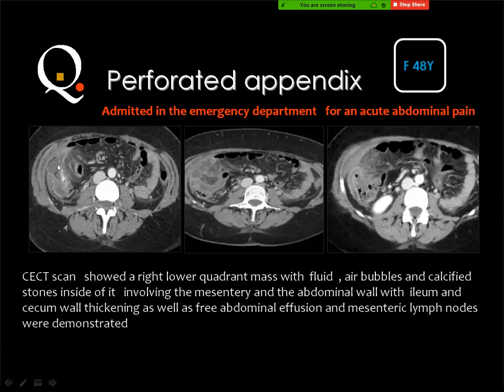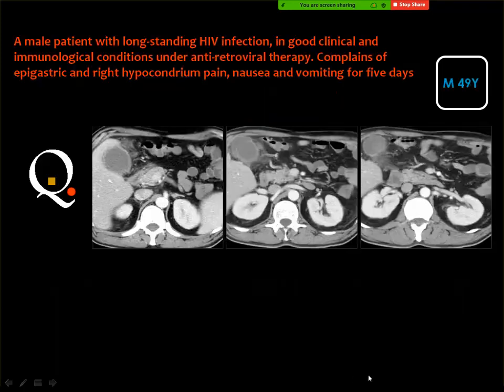And this is one of the pathognomonic landmarks for this lesion to belong to the appendix. And this appendicolith should be surgically removed whenever draining this abscess, otherwise it will remain and form a foreign body that will accumulate more infection.